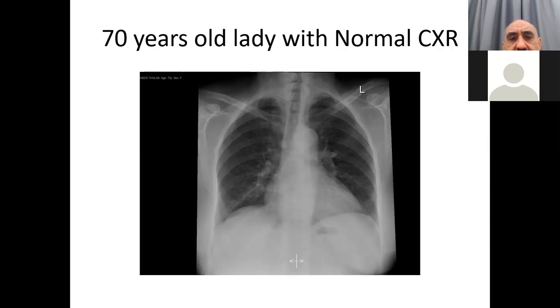We are going to discuss chest X-ray in cardiology today, this evening, and have a nice weekend. The first slide is about a 70-year-old lady with a normal chest X-ray. These are normal findings for a 70-year-old lady.